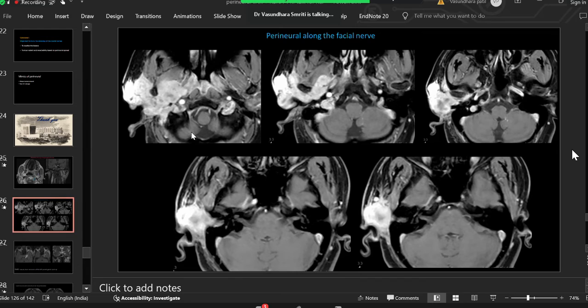No, facial nerve I can identify up to the main facial nerve, and if one of the particular branches is thickened, but not the remaining, not the branches. I'm not able to identify the further branches of the facial nerve.